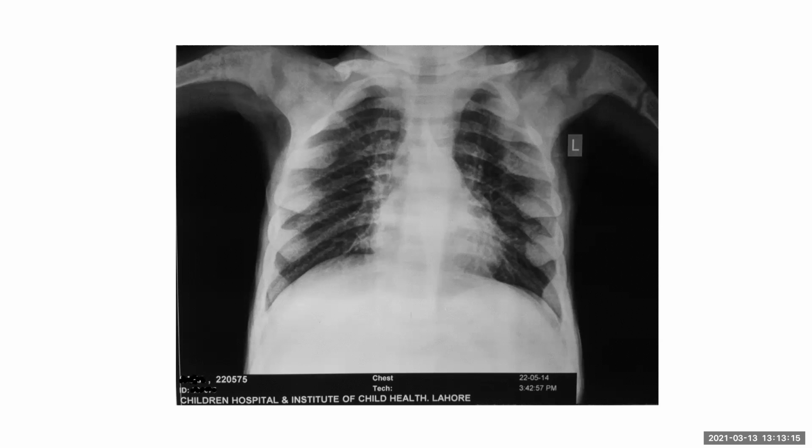So with this, I am thinking of the possibility of a metabolic bone disorder. It can be rickets, with bulbous anterior ends of the ribs and widening of the junctional zones, and also the multiple fractures.